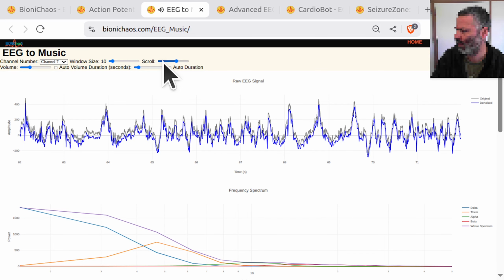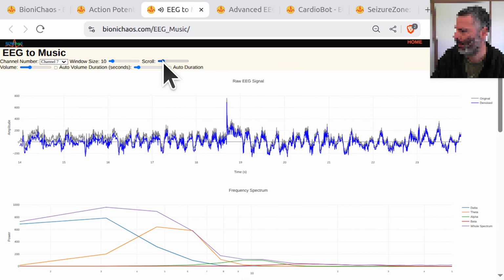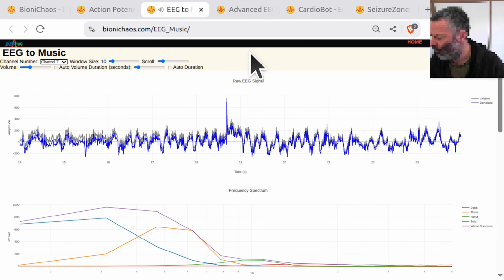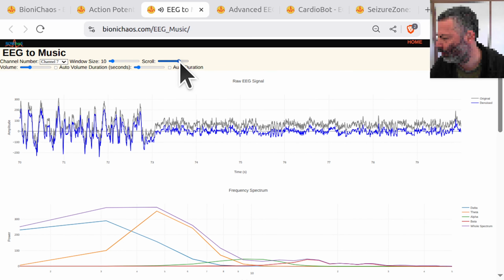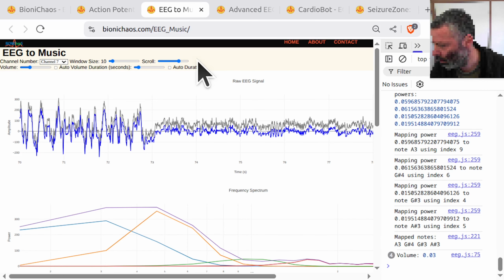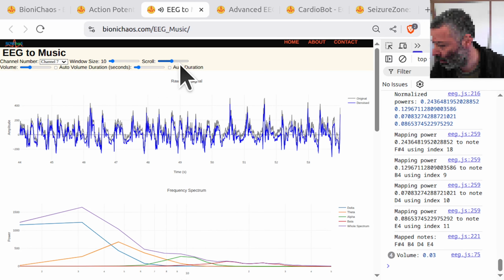Now, let's take that signal and make it sound beautiful. Or terrifying. This is the EEG to music sonification tool. This is the part where the data becomes art. It takes the brain's electrical chaos, be it delta, theta, alpha waves, and assigns them to instruments and pitches. It's a real-time data translation. A high-frequency beta wave, concentration, might trigger a fast snare drum, while a slow, deep delta wave, sleep, triggers a sustained bass note. You're hearing your consciousness.